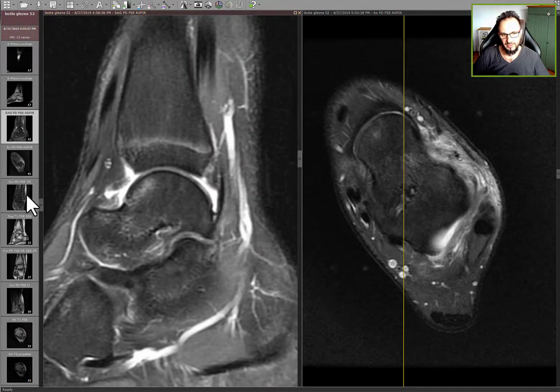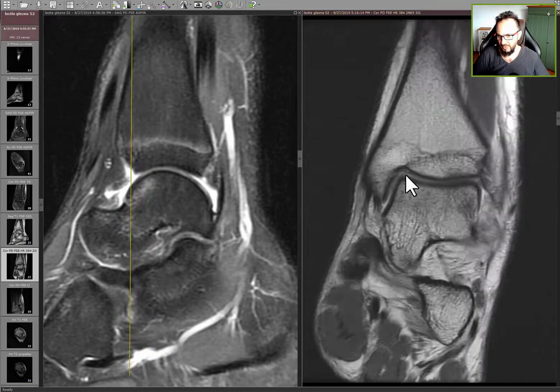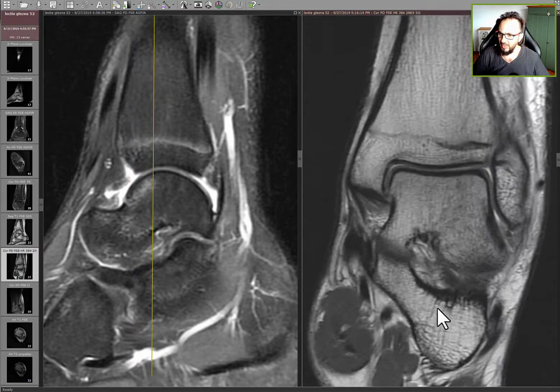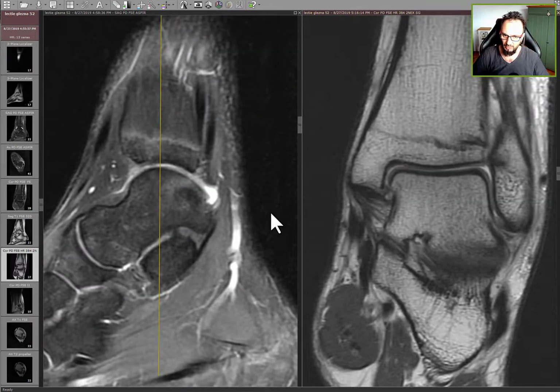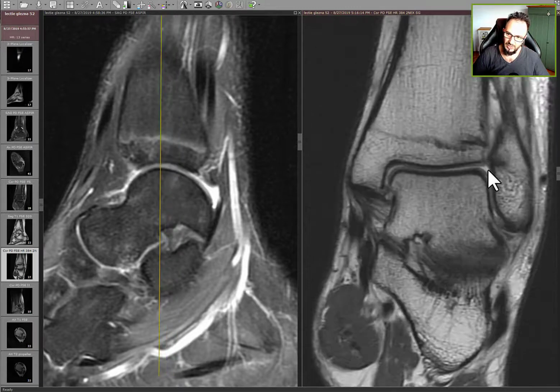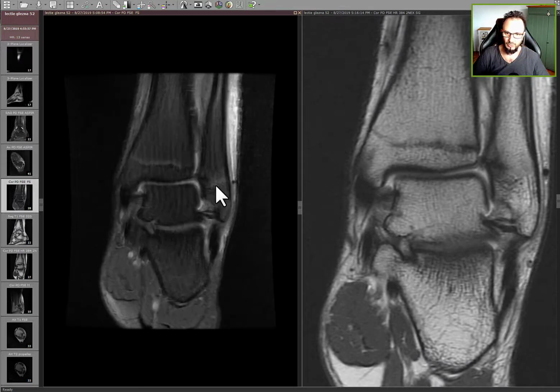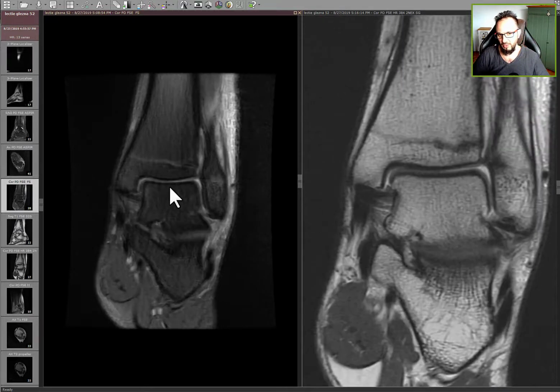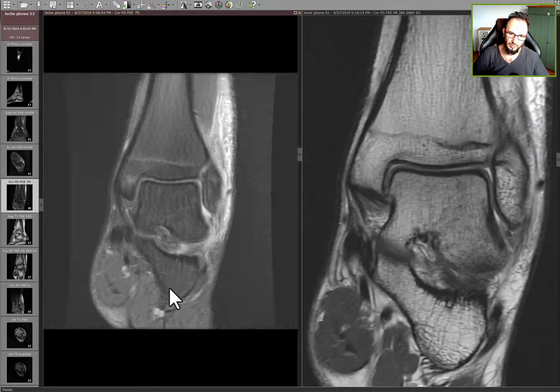Let's take a look at the cartilage. So the cartilage seems to be alright, maybe some problems here, but without any bone marrow edema around, so probably old cartilaginous problems. You see these problems in the metaphysis, which might be physiological, but they also could be due to stress. There is inequality of growth plate ossification, probably due to overuse.